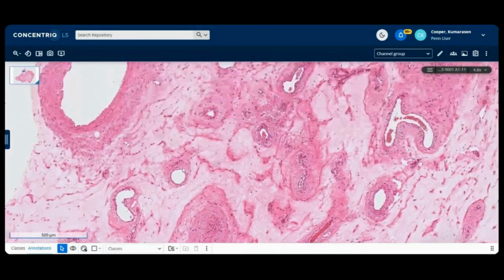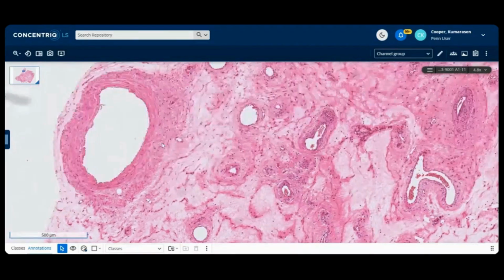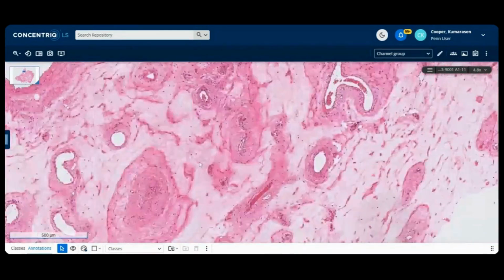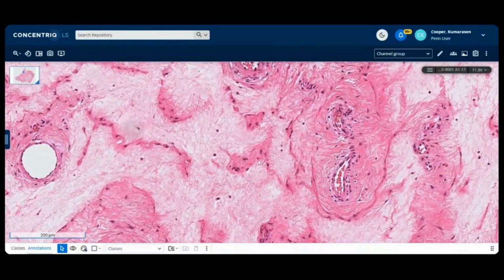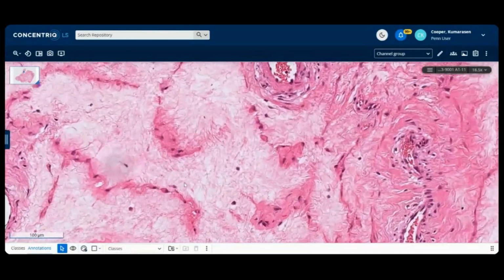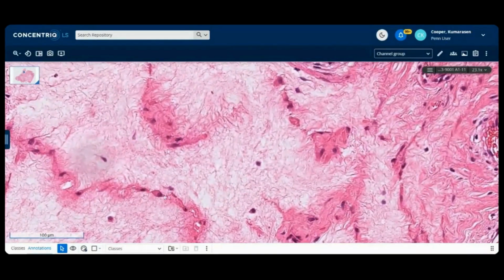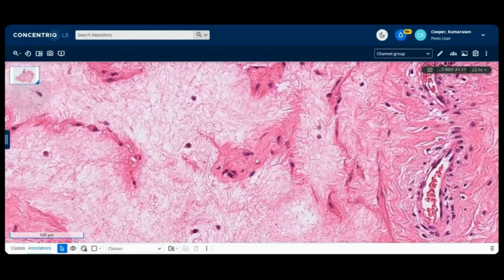Now, whilst I've been jabbering along, you've been looking at the morphology here, right? You can see the vessels, the edematous stroma, and then within the stroma, there's some of these sort of strands of cells, which look like blood vessels. But as we go closer, you can see these are ovoid, maybe a little spindled, and there's a little collagenous background.